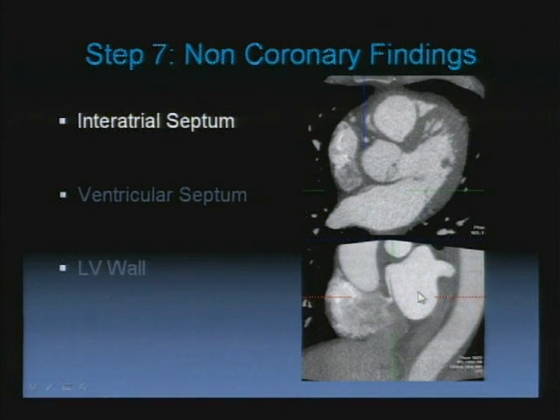You do a short axis oblique view through that. So here's the right atrium, the left atrium, and you'll see this oblique column of contrast jetting into the right atrium. So this patient has a patent foramen ovale. Then you'll remember to go back and look at the pulmonary artery to see if it's enlarged, to see if there's a significant flow. And you will see this up to 5% of your patients if you look.